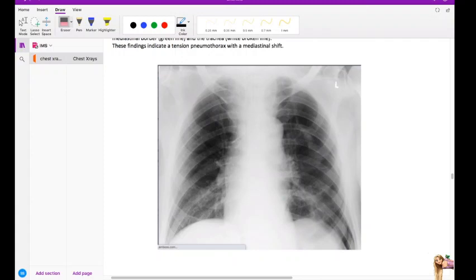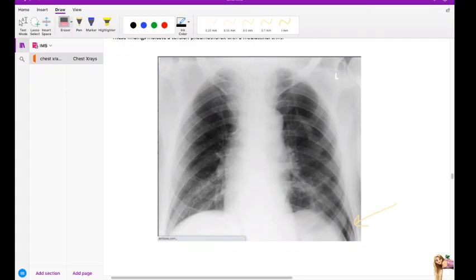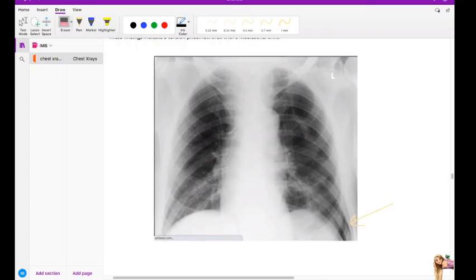All of these are pneumothorax. We'll come to consolidation in some time. What I'm trying to show here is the deep sulcus sign. The other findings are not that clear. Translucency and vertical line, but the sulcus sign is more prominent over here. Yeah, there might be something else. I'm not sure. Might be some other pathology. I just took this for the sulcus sign.